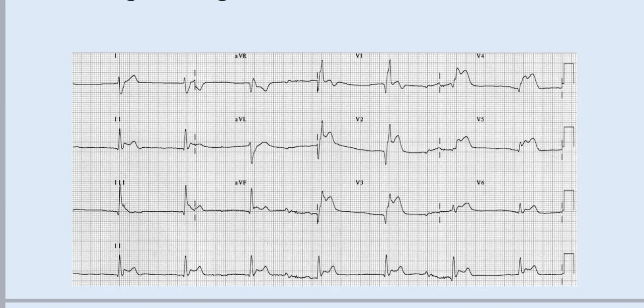Patient presented with chest pain, subtle T-wave elevation, and sometimes dramatic ST segment elevation, just like every STEMI, and a humble elevation in TNT, troponin. Patient taken to cath lab, normal coronaries. Now, in retrospect, Takotsubo is the diagnosis.